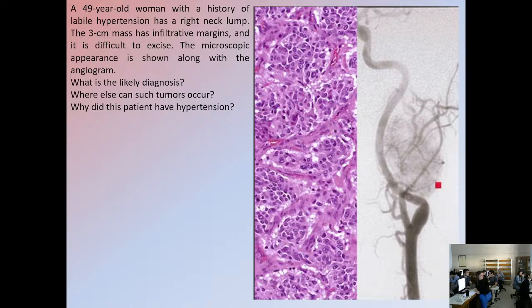So, it can have a glandular configuration, and this is compatible with epithelial origin. Not always. Immunohistochemistry will show. But when you see a neoplastic cell population with homogeneous cells, you suspect neuroendocrine differentiation. This may be a neuroendocrine neoplasm.